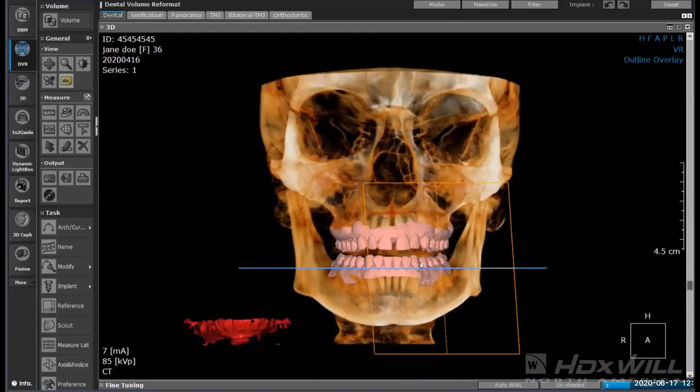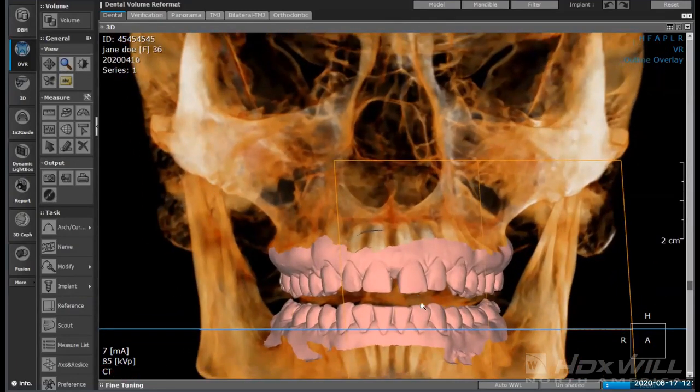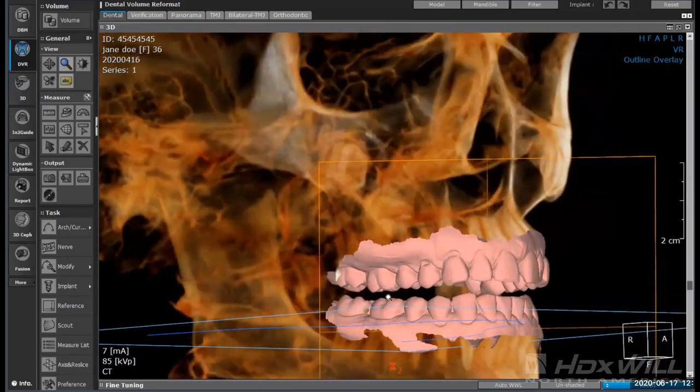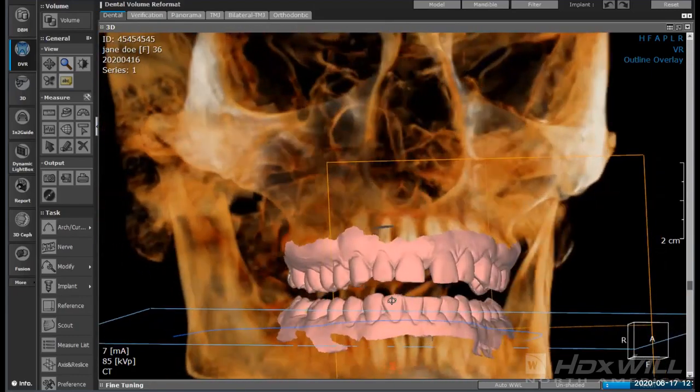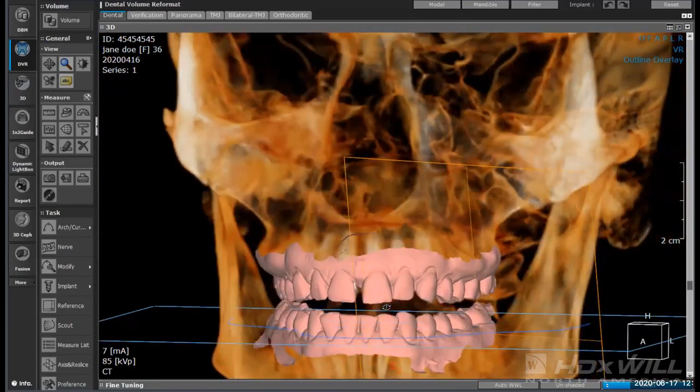that I've been able to load the STLs of her upper and lower intraoral scans, and they overlap the bone. A couple of things that are good about this is that we can actually see compliance. Every time the tooth is out of alignment, so I can right click over here, you'll see some white show up where either the scan didn't exist or there isn't agreement with that. But you're able to align the STL model with your bone. And then that gives you the soft tissue interaction. So I'll bring this down again.